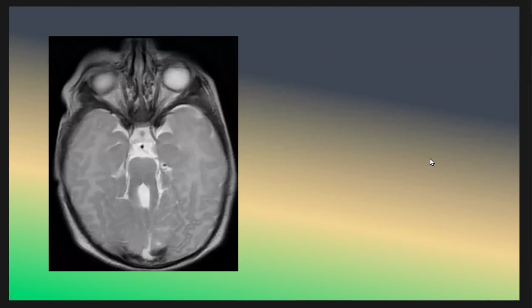What do you think the patient has? This is classic. This is the molar tooth sign, and this is Joubert syndrome. Okay, we move to the next case. What do you think the patient has?